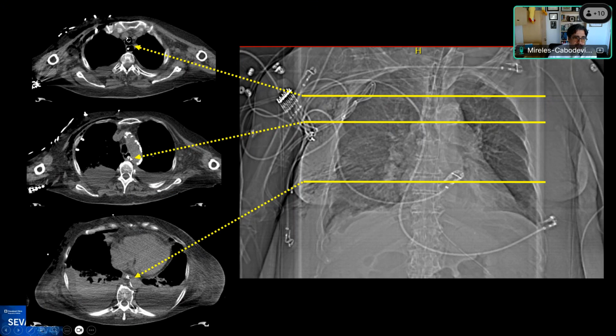And you can see the esophagus with the catheter inside, and how it's related to here, the side of the aorta, but on the other side, very closely related to the pleura, but again, the posterior wall of the trachea. And as you move lower, and this last cut that I put over here, you can see the relationship with the catheter and the heart and the pleural space.